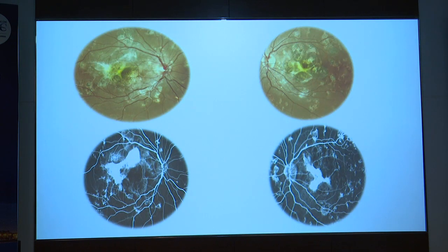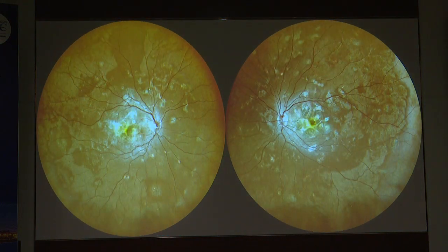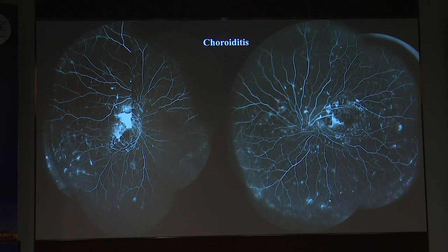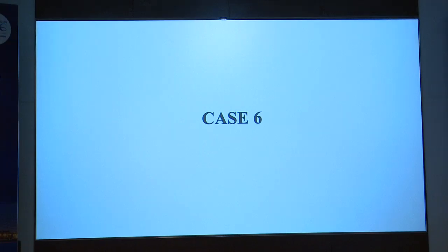Another case, 26 years female. Now this is a treated case of choroiditis. She complained of blurred vision. Well, I could see the scars. We did an angiogram and it was like this. It was showing scar staining. Look at the color photo. We did an ultra wide field angiography. Yes, scars were only scar staining, but if you see, the dropouts have started in the periphery. So a choroiditis associated with ischemia. Now your line of treatment is totally different. You don't need to just observe it. You need to treat it with lasers if you think, or treat it with an anti-VEGF, whatever is your choice.